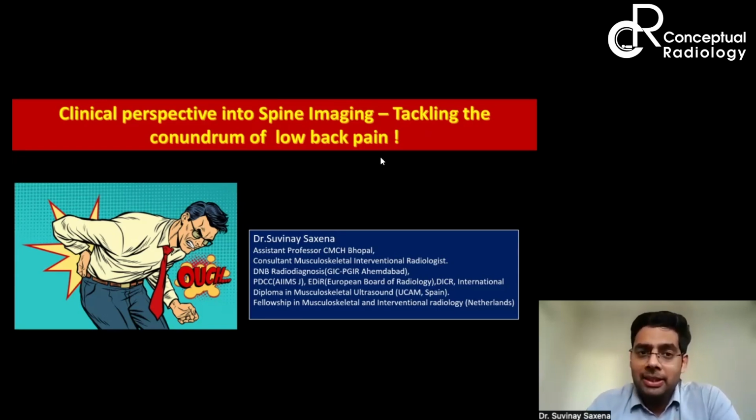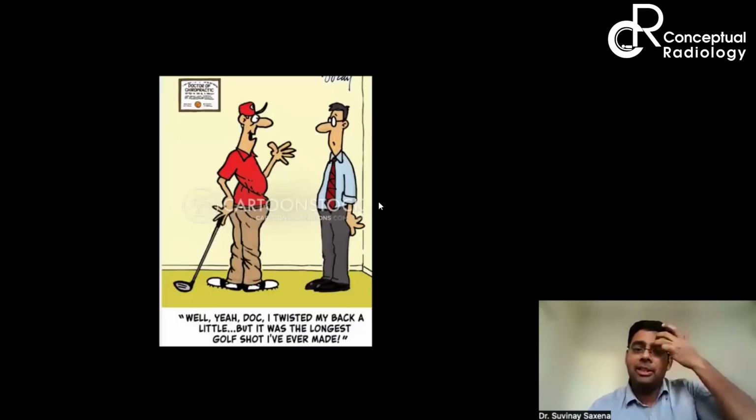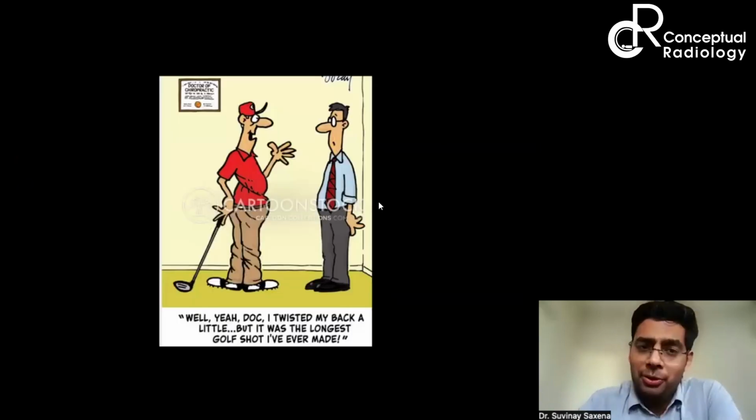So today the presentation might seem to be a little on the basic side because I am going to teach you spine anatomy and about the degeneration. Spine MRIs form the bread and butter for all radiologists because you get a lot of MRI spines. As soon as you pass out, you'll be reporting MRIs, and spine MRIs form around 60% of your bulk load of reporting.